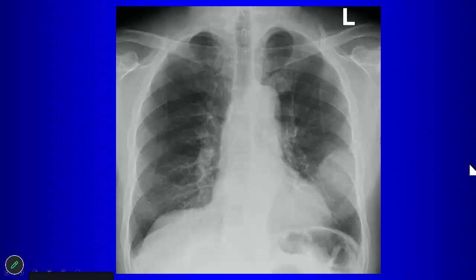Is that mass benign or malignant? Certainly it's large, you'd be concerned about malignancy, but is there any finding here that makes you more concerned about malignancy? Isn't that again a posterior rib discontinuity there? Well, let's see. Do you see this posterior rib? Yeah, I can see that. Do you see the cortex here? Yeah, that's good. You know what, I'm getting faked out, that's fine. Okay, so that's likely benign. Does anybody see something else?